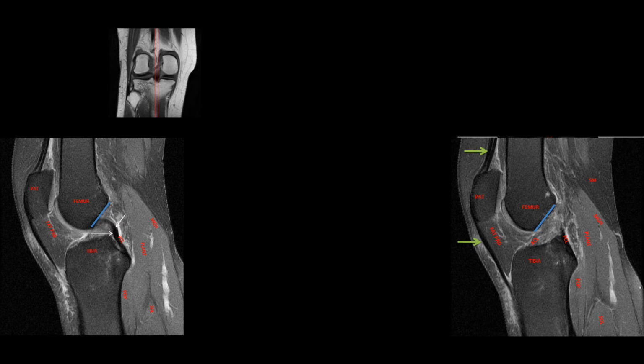And then a little more detail here as we go a little closer to the middle. So you see your femur, your quad tendon, patellar tendon, fat pad underneath, your gastroc here, and different of the calf muscles here as they form behind the tibia.